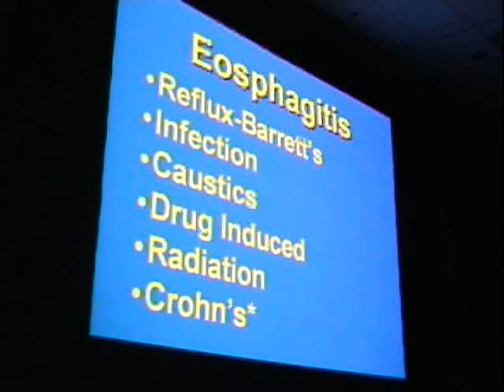Remember that Crohn's disease basically can occur in the upper GI tract, and the key thing to do next, if you see that, is just keep the barium going and finish the examination with a small bowel follow-through to see if the ileum is abnormal, because most of the time, when there's disease in the proximal GI tract and Crohn's disease, the ileum is also abnormal.